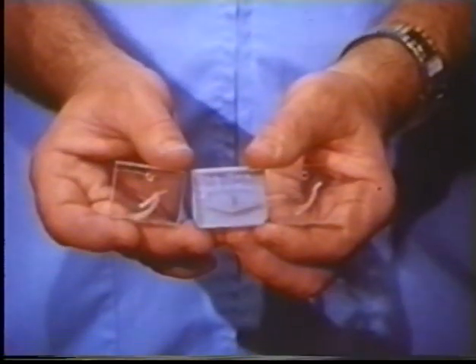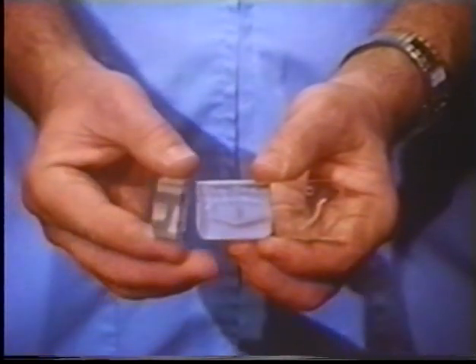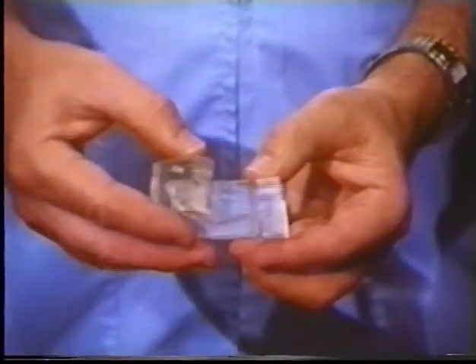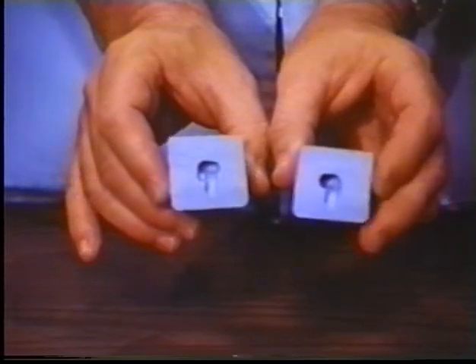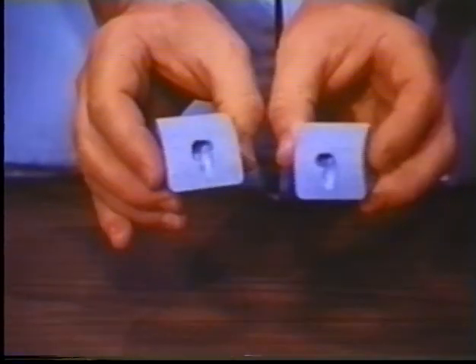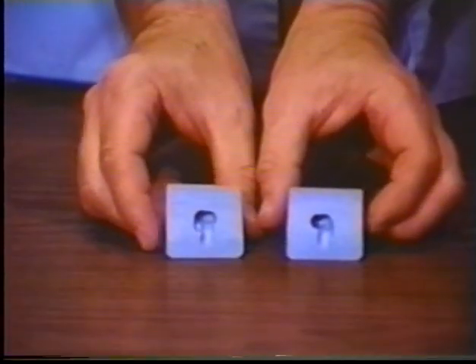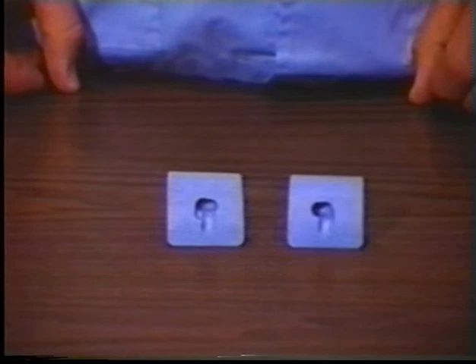Here in these resin blocks are recorded in 3 dimensions the right and left lateral and protrusive movements of this patient's mandible. Part 2 of this motion picture will show how the information stored in these 3 blocks is reconverted by a secondary pantograph to locations near the condyles. This procedure produces a pair of motion analogs which will serve to guide and control the movements of an articulator for simulating this patient's characteristic jaw movements.